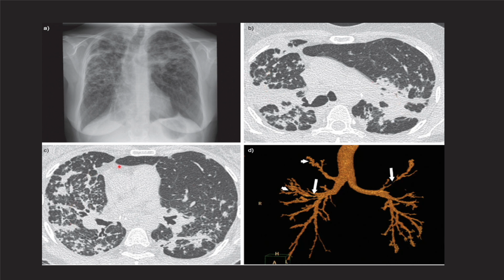Here there's a lot of structural distortion, a lot of pulling of the mediastinal structures, and when you see a volume rendering image of the bronchi, you see that the bronchial stenosis is occurring because of this distortion at several places. So conglomerate masses, posterior location, superior upper lobe, middle lobe involvement, and with distorted, not TB, and also bronchial stenosis. This is sarcoidosis.